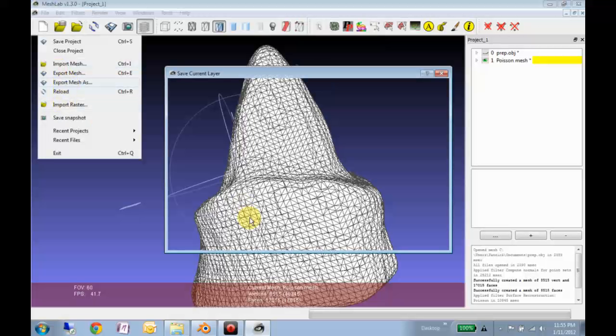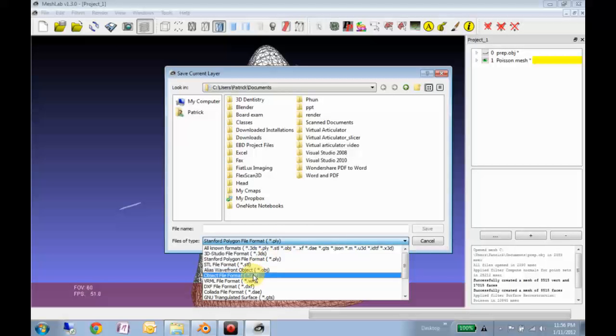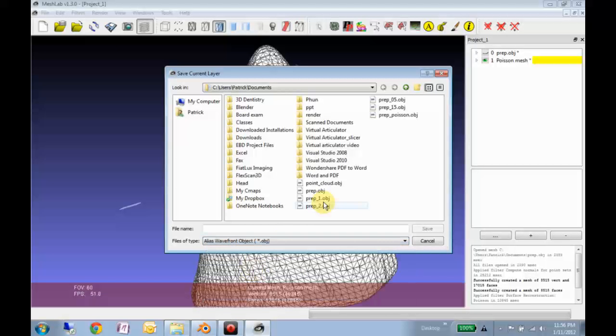So now we're going to export this mesh just back into Blender, just so we can compare the original. From here you could go straight to STL and then into whatever different program you wanted to. So I think I called it this last time.